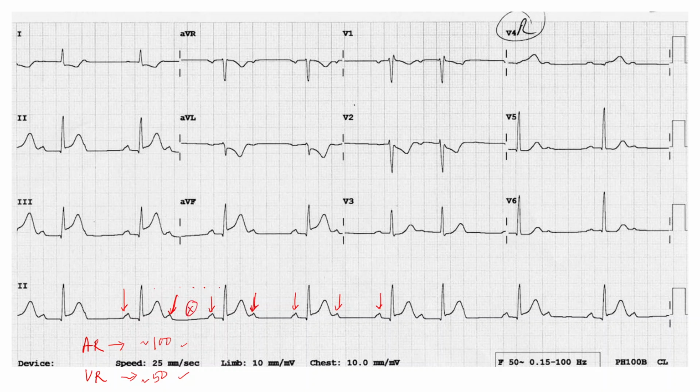Alternate impulses are being conducted, and that means for this P wave there is no QRS. Again for this P wave there is no QRS. Again for this P wave there is no QRS. That means only alternate impulses are being conducted, and alternate impulses are not being conducted. This is known as 2:1 block. Now in this condition, it is very difficult to tell whether it is a Mobitz type 1 block or type 2 block, because we are not able to find the progressive prolongation of the PR interval.